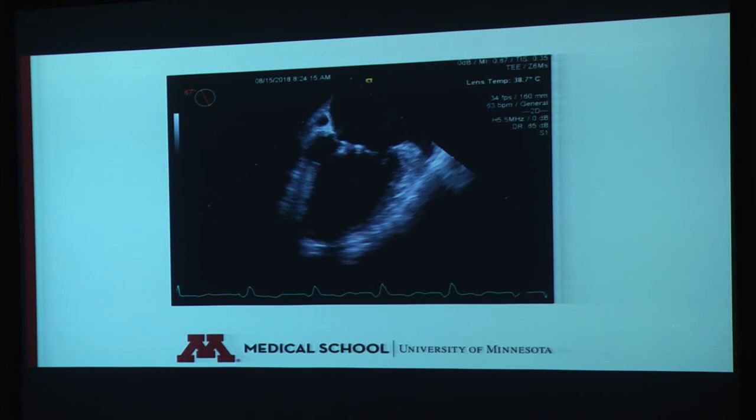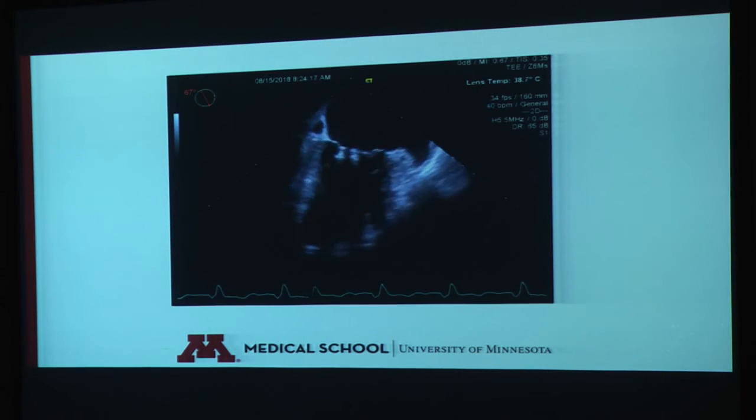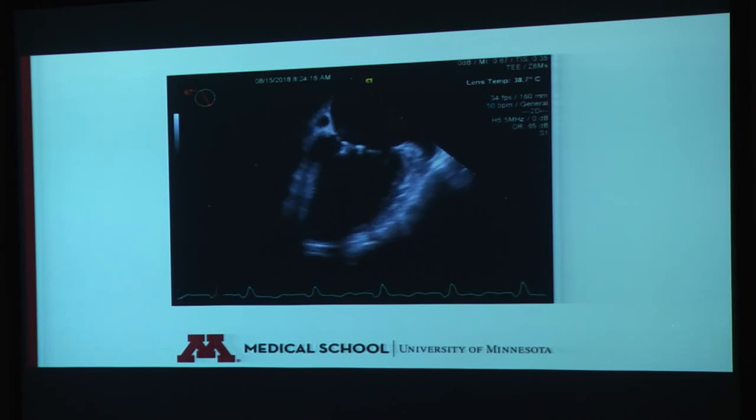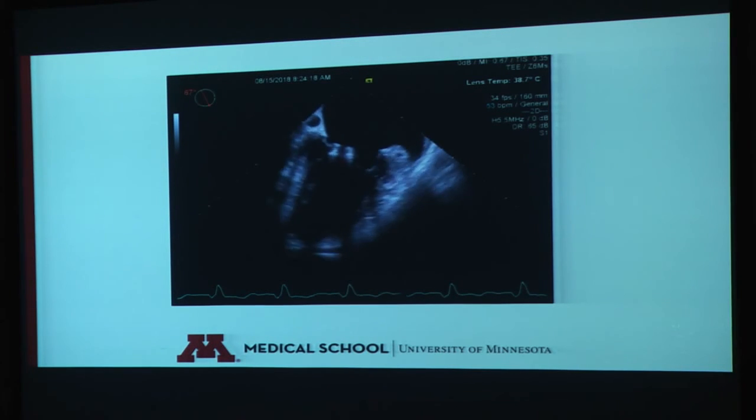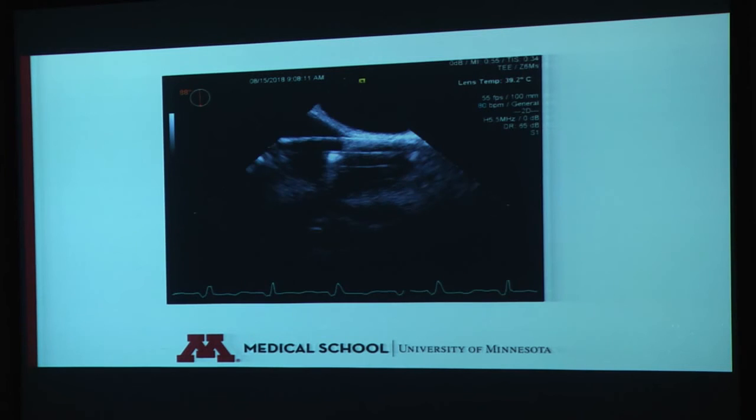So pre-bypass, we got some clips here, and what you can see here is a lot of acoustic shadowing due to the calcification of the mitral valve. And as you can see here, if you were trying to evaluate the walls of the left ventricle, that would be pretty difficult to do.